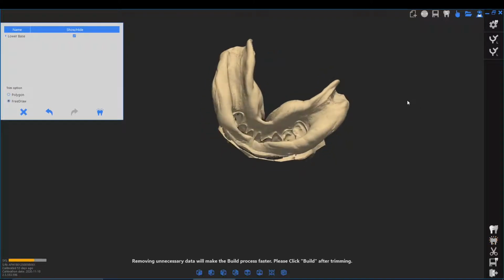And that should be sufficient. Press this tooth right there to finish the build. Just slowly going into orange a little bit. My computer is not as strong to handle major processes. It still handles it, just takes a little bit of time. I haven't had it freeze up or anything with this program, but it does take a little bit.